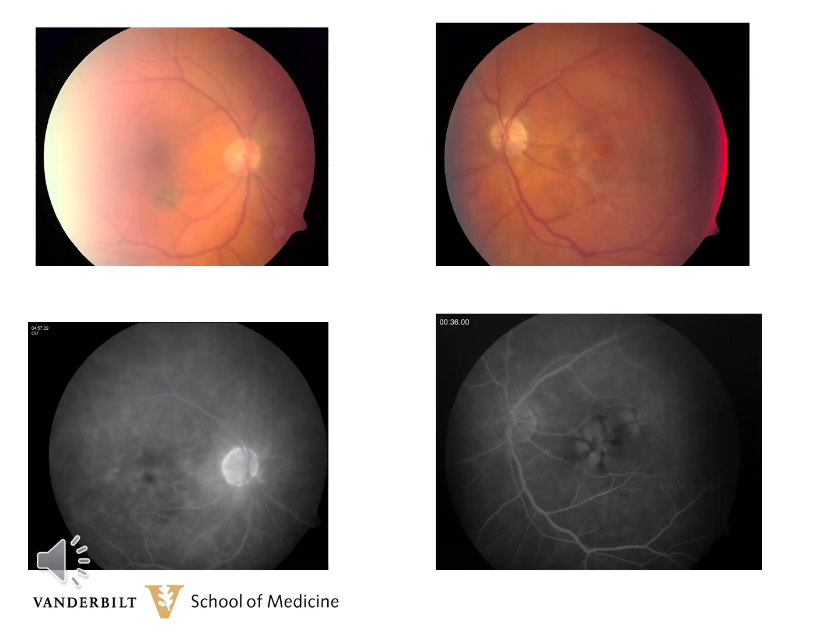As with many diseases and dystrophies, the presentation is not always symmetrical. Here's a 49-year-old male who has vision of 20/30 in the right eye and 20/60 in the left eye. The butterfly pattern is better defined in the left eye than the right eye. You can see this pattern a little bit on the color photographs. On the fluorescein angiogram, this is a very typical spoke-shaped pattern of alternating hyper and hypofluorescent wings.